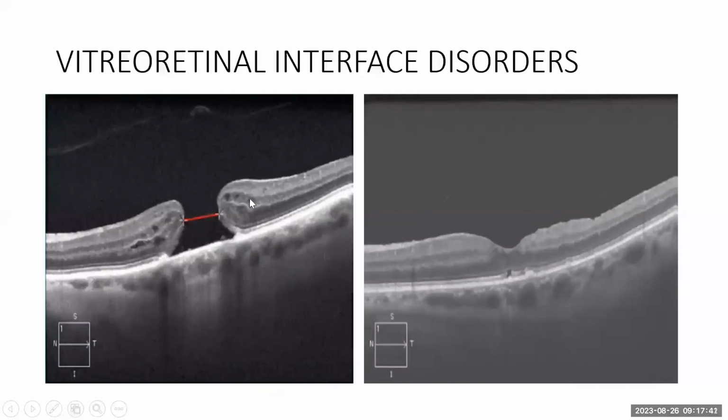The layers are distorted. This is post-surgically. The patient had an ILM peeling. This is the ILM here. ILM peeling and inversion over the hole. This is 2 months after the surgery.